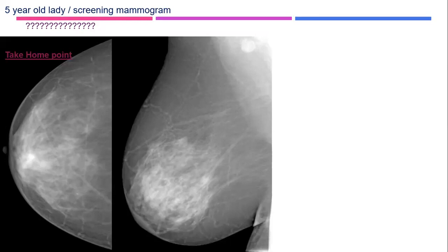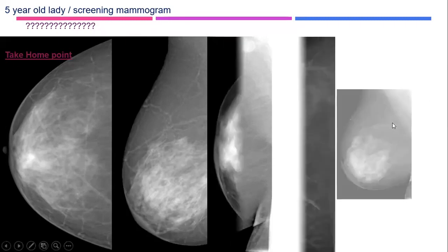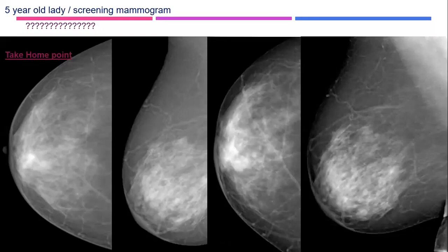Nothing was done for this lady, and she came in for the second round. This is the mammography after 1 year.